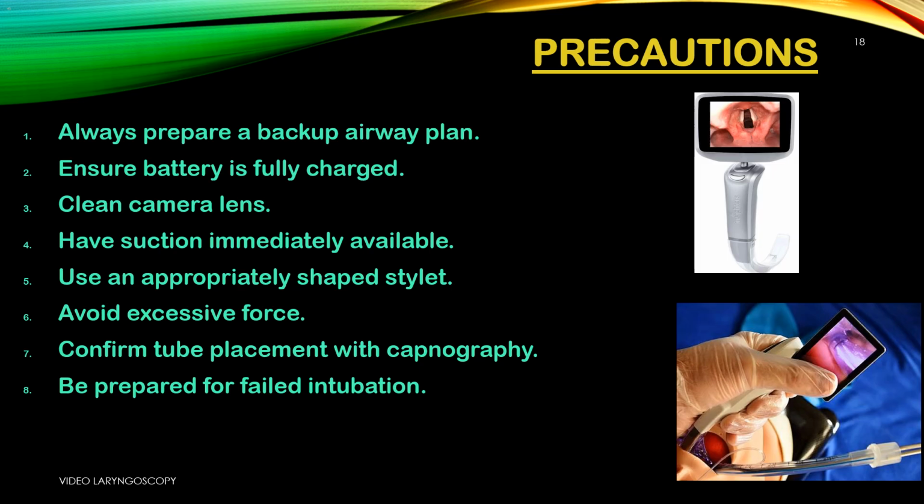A dead device mid-procedure is dangerous. Check power before starting any case. 3. Clean camera lens. Smudges or secretions blur the view. A clear lens gives the best glottic visualization.